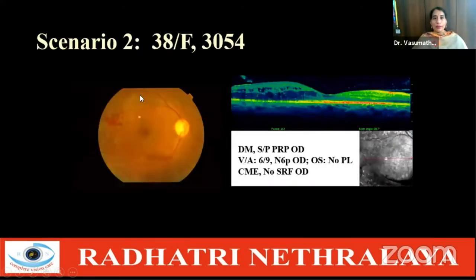And in tractional detachments also, OCT gives us an idea about the extent of the TRD and helps us in the treatment. For example, in this patient, a little bit of traction here, you can see, but there's a cystoid macular edema. The foveola actually seems a little okay. So you just manage this patient with anti-VEGF injections.